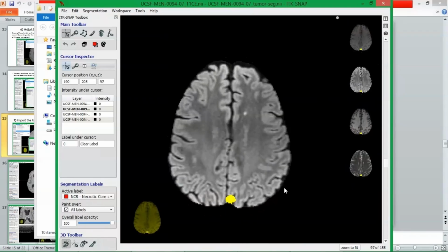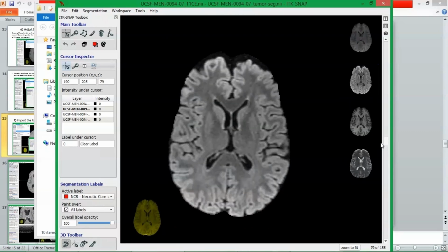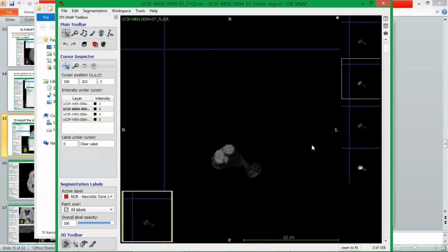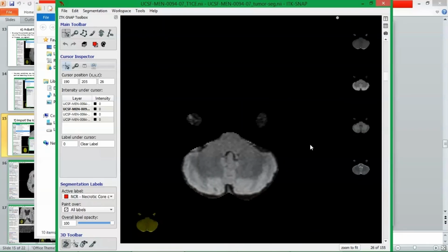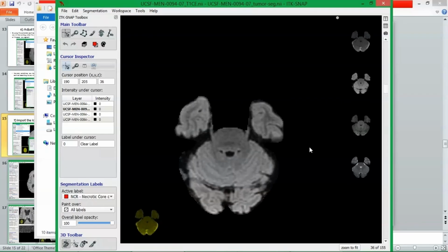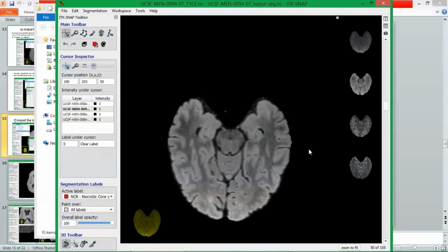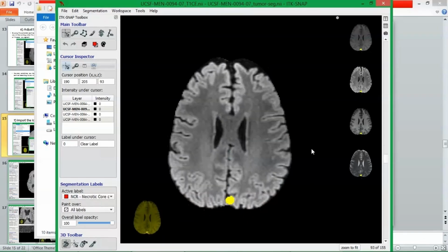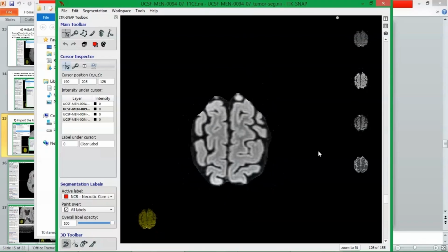The first thing I do when I start a case is to just not focus on lesions, not focus on the label, just go from top to bottom or bottom to top through the case so that I can orient myself on what I'm gonna be dealing with, and it will help me to create a quote unquote battle plan for how to handle the case. So I just scroll through the case to know what I'm gonna be dealing with, and then I focus on the separate lesions.